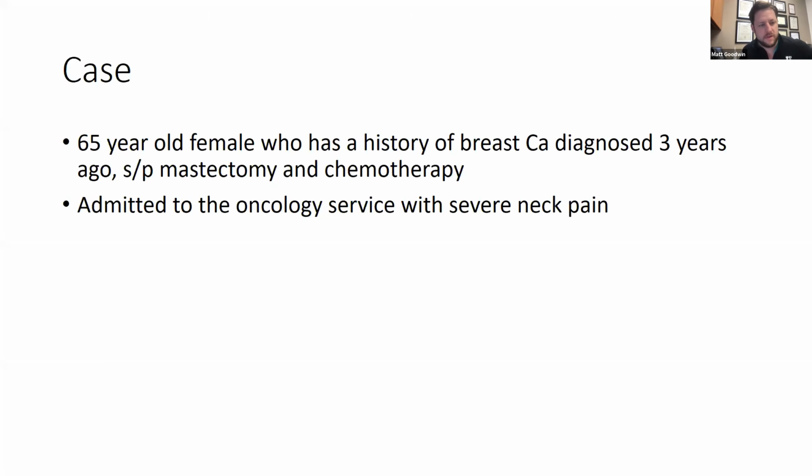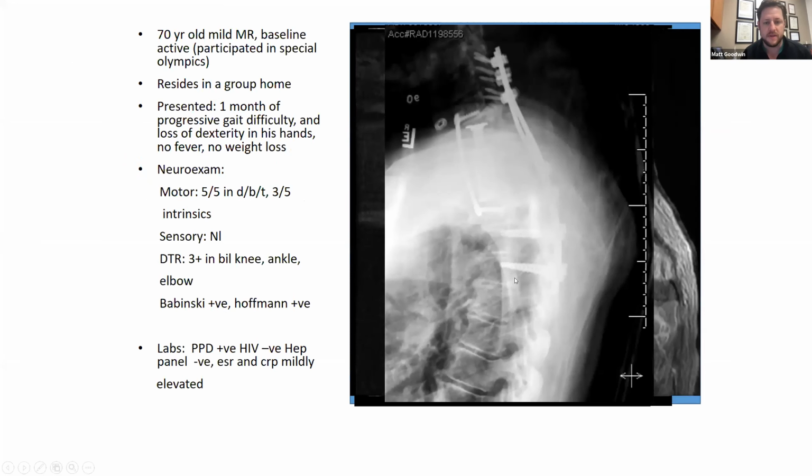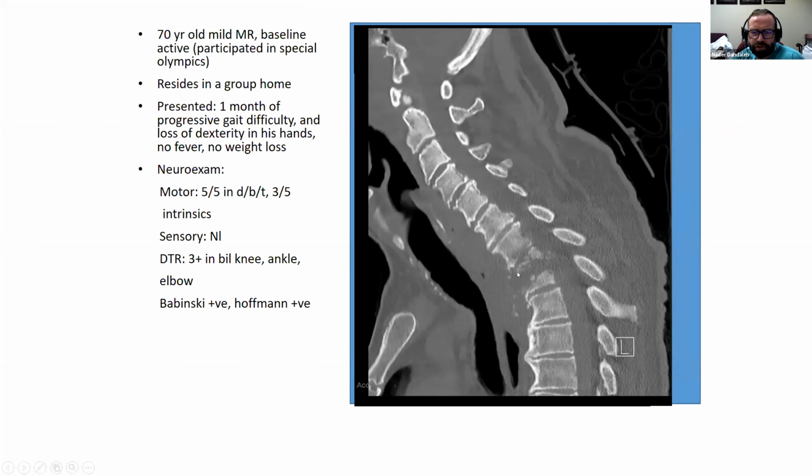It just looked like there was really poor bone there. If you were to not do anything at that CT on the right, yeah, there's not too much anterior column, but you're depending on the rib cage, you're not going to get perfect correction. He's going to be a little kyphotic without anterior column reconstruction. The other thing with the posterior decompression, you're weakening it even more. You're adding hardware, but you're weakening that segment more without reconstructing the anterior column. That probably is the downside.